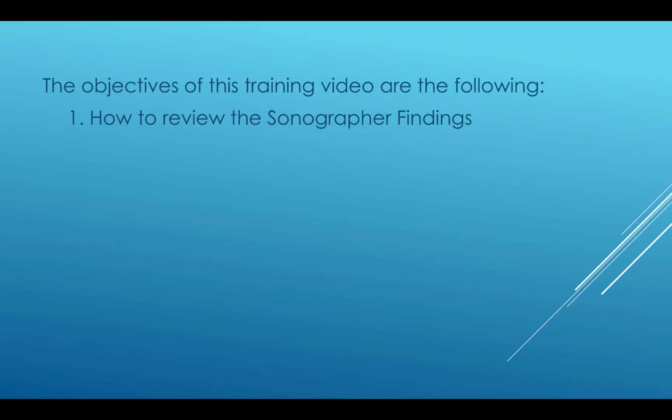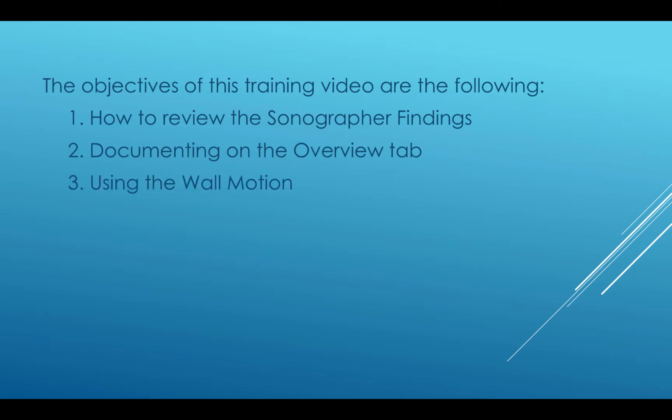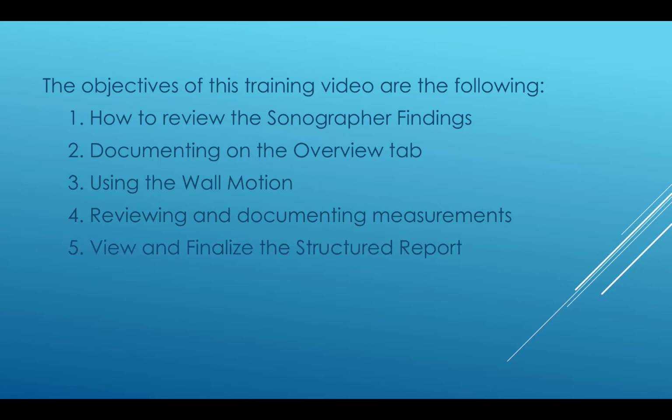1. How to review the sonographer findings. 2. Documenting on the Overview tab. 3. Using the wall motion. 4. Reviewing and documenting measurements. And 5. View and finalize the structured report.